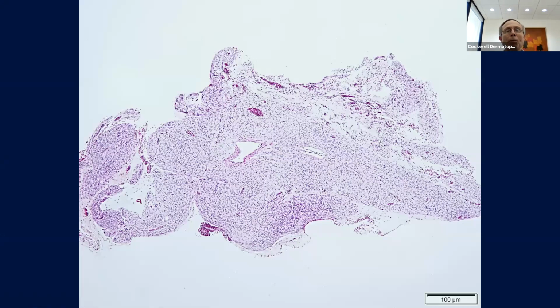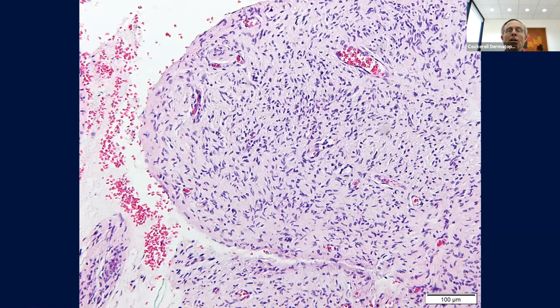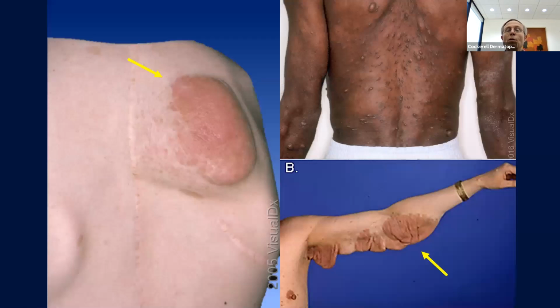So we've got a biopsy of a spindle cell lesion. Can't really tell much about breadth, symmetry, or circumscription because it's something out of a bigger lesion. As you go to higher magnification, hopefully for a lot of you 3rd years, this is reviewed. You can tell it's a spindle cell neoplasm with fibromyxoid stroma, with mast cells admixed in here. The cells have S-shaped nuclei. So it's a neural neoplasm with a lot of stroma and little plexiform areas. So this is an example of a plexiform neurofibroma.